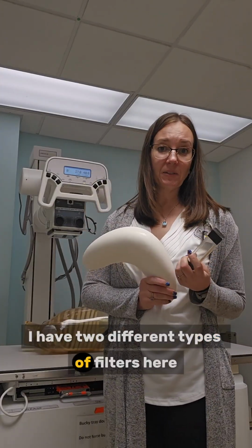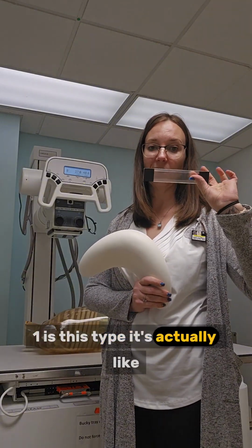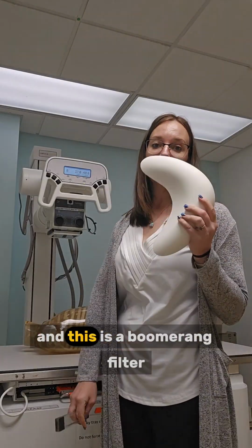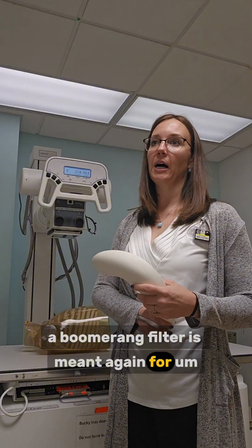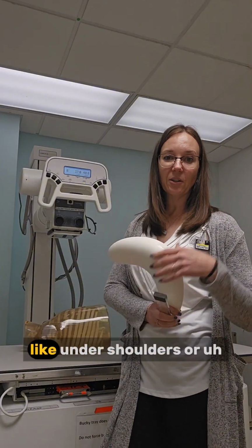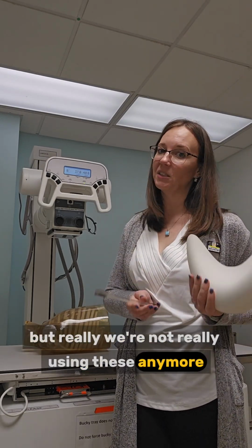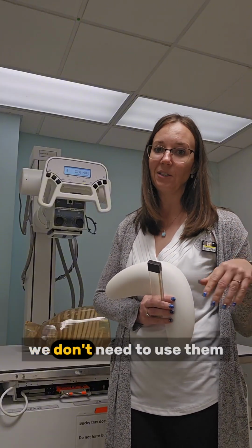I have two different types of filters here that I could demonstrate to my class. One is this type. It's actually kind of known as a scoliosis filter. We used to use these when you took an entire body in one picture. And this is a boomerang filter. A boomerang filter is meant, again, for large subject contrast difference parts. A lot of times we used it under shoulders or standing feet, things like that. But really, we're not using these anymore. Most of the time our software is fixing these images for us. We don't need to use them.